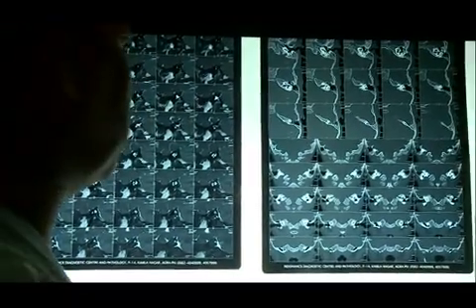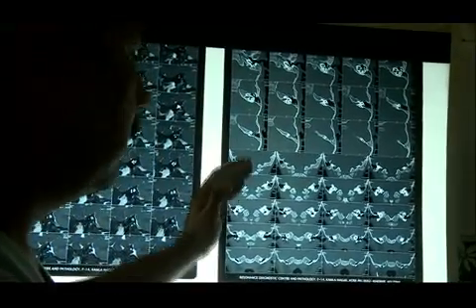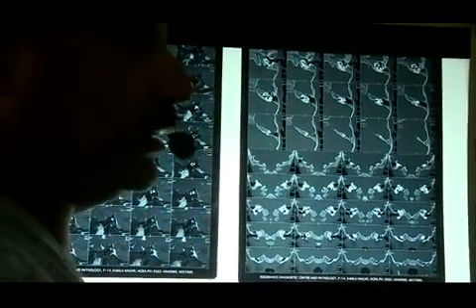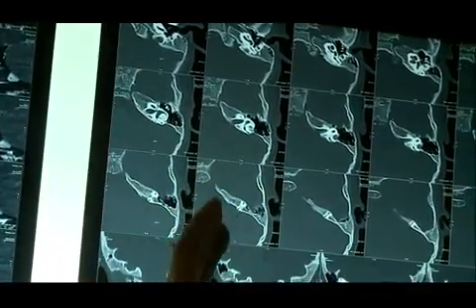The rest of the details you can take from the CT scan. What you need to see in a CT scan in a cochlear implant patient: the size of the mastoid cavity, and the dura. If it is a low dura or an anterior sigmoid, it can complicate things and you may have to change your approach. Second thing is the facial nerve. Any anomaly of the facial nerve can complicate your surgery.